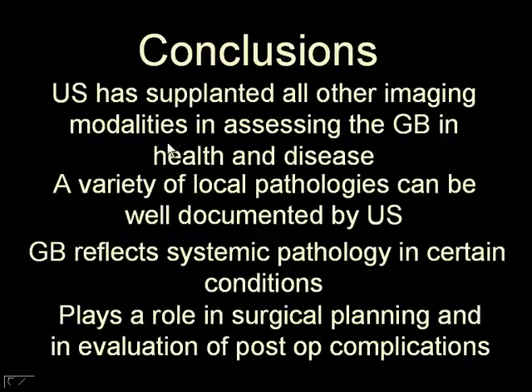So ultrasound has supplanted all other imaging modalities in assessing the gallbladder in health and disease. A variety of local pathologies can be well documented by ultrasound. GB reflects systemic pathology in certain conditions. It plays a role in surgical planning and in evaluation of post-op complications.